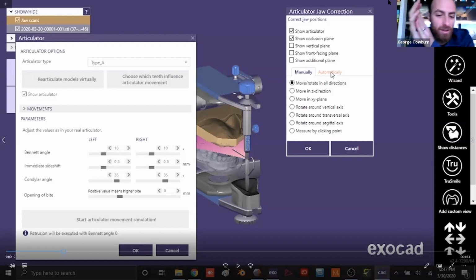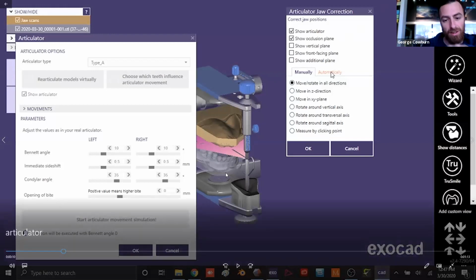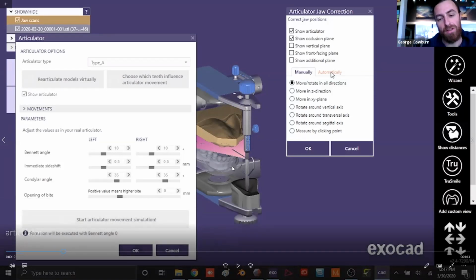One caveat and warning I'll give is for edentulous lowers, it doesn't work as well as it does for dentate lowers. So in this case here, you can see we have natural mandibular teeth. And so the tracing devices are very accurate when you have stable anchors on your mandible. So whether they're implants or teeth, if you have something physical to anchor to, your registrations are a lot more accurate. If you're securing your registration device on an occlusal rim, there is less certainty that it's staying put. And so there's more noise in the results. So we trust them less.